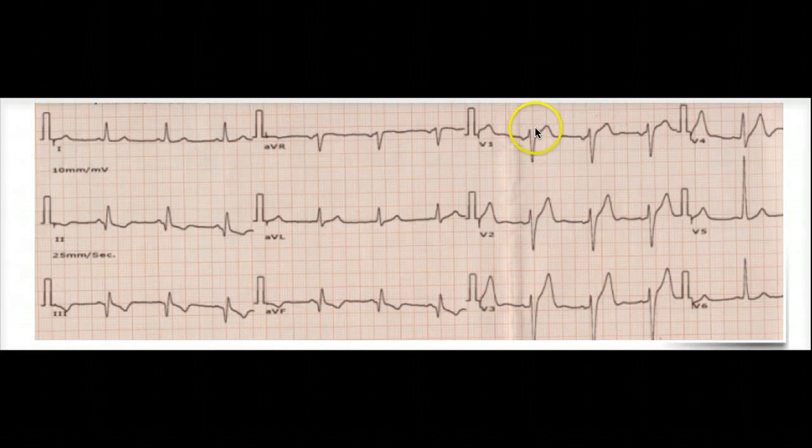Do we see any Q wave here? By the way, what are these? These definitely look like Q waves, right? But they're not. Why are these not Q waves? Because what did I say? Q wave was the first negative deflection. Sometimes we don't even see Q wave. We don't really see Q wave here. This is R, this is really S wave. So don't get confused whenever you see a negative deflection. Q wave has to be the first negative deflection.